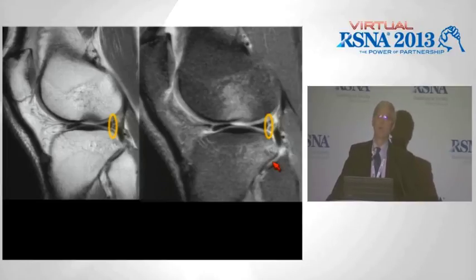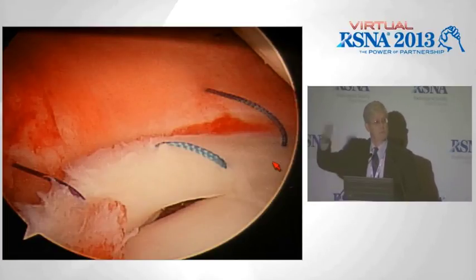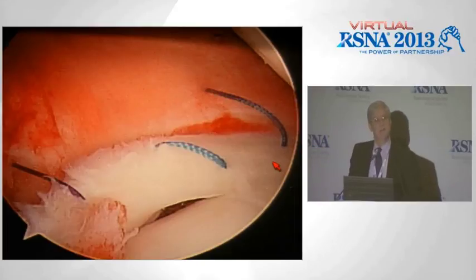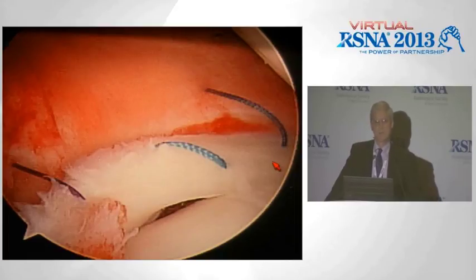I will tell you, your surgeon will be more interested in the meniscal tear because they already know there's an ACL tear. They are actually better than we are at testing for cruciate ligament tears. They're much more interested in fact, whether there is a meniscal tear or cartilage damage. Now, the other thing that they can do is they can put a suture around these, so it's total meniscal preservation as they put that figure 8 suture and tie it tight as well. So that's important also. If they go in and repair the ACL tear, these can also over time become unstable.